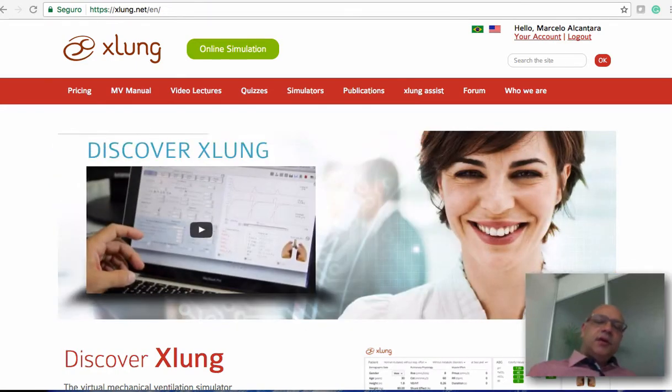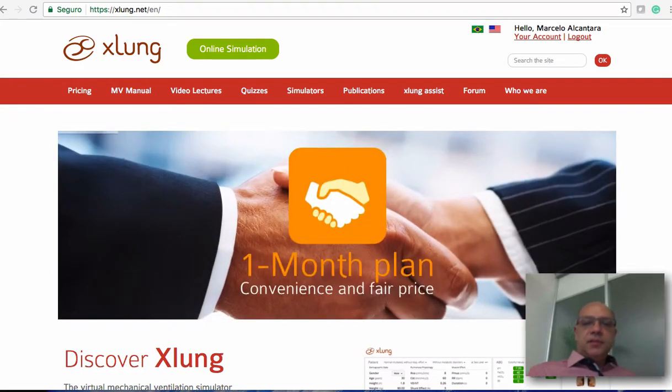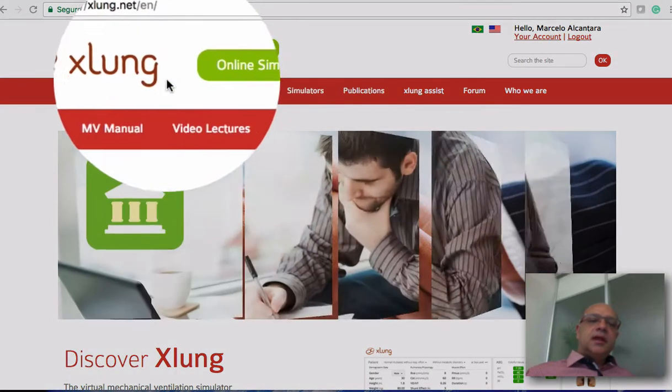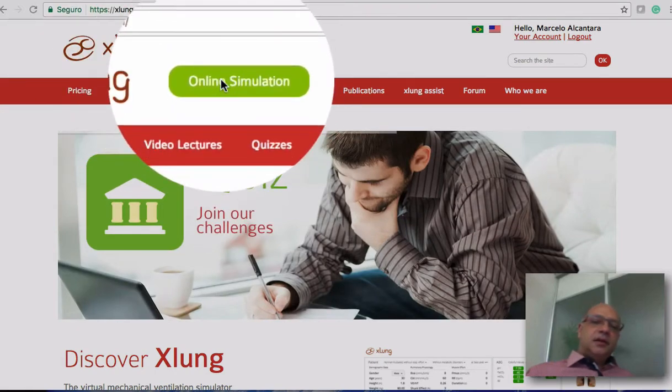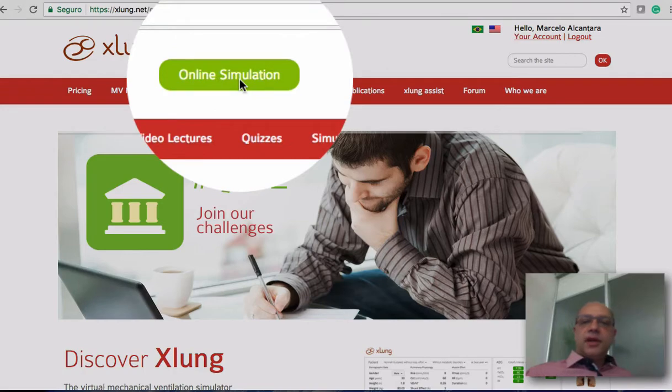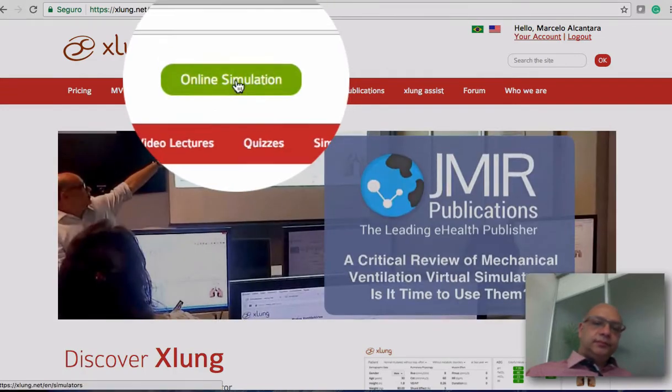In this video, I'll show you how to access and use the Xlung 2.0 simulator for teaching mechanical ventilation. So, let's access the online simulation at the Xlung site, xlung.net. Here I click on the online simulation button.